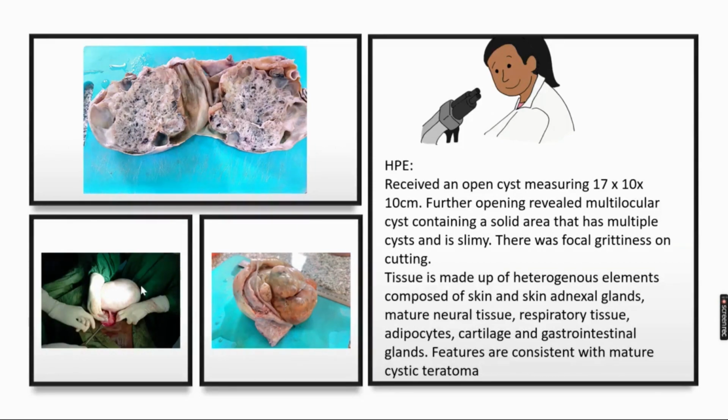She had surgery, note the ovarian cysts and the normal contralateral ovary. This picture was obtained at the histopathology laboratory with the cut surface showing the multilocular solid nature of the lesion.